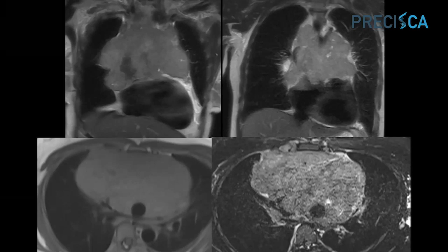And the MR is a really nice tool. I like this example because it allowed us to look at some of the sequences that we use routinely for MRI evaluation. So our MR standard chest protocol consists of doing coronal images with a very fast sequence. This sequence is a single shot echo sequence, which allows for very quick images. So each image stands alone. So if the patient has trouble breathing, you don't have to worry about the whole volume having motion artifact.